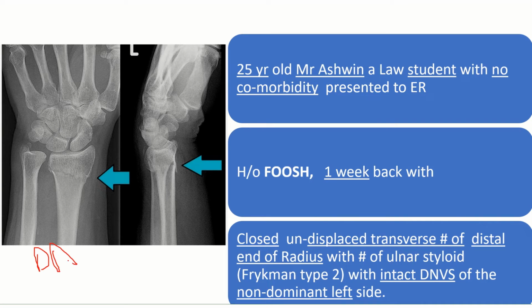The date is missing in this case, and also the patient's name on the X-ray film. So you have to be very careful about it. There may be a trick question in the exam. You always have to identify the patient's name and date on the X-ray before proceeding ahead. Otherwise, this could lead to a lot of problems.